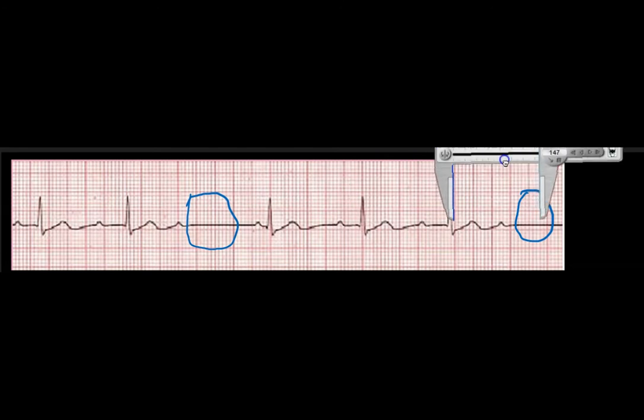So this is irregular, but because it's occurring every so many beats, you will notice that here's one beat, here's a second beat, here's a third, okay? Here's one, here's two, here's three. We missed one where there was supposed to be a fourth one. Now, this is occurring regularly. If I had another EKG part here, you would actually see that there's a P wave and a QRS complex that sits out in this area. So this is something that is actually occurring, this irregularity.